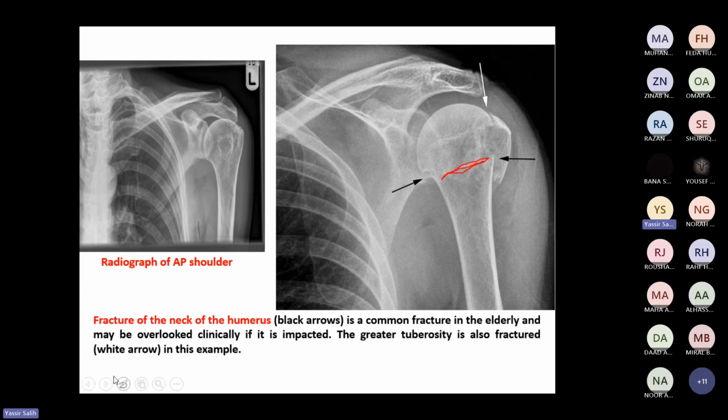Yes. Is it well seen, or where will we visualize this fracture? Where is the fracture? Maybe a radionuclide bone scan should be used. In the plain X-ray, do you see the fracture well? No. Just on the side maybe. Yes, on the side we can see it, but it can be easily missed.